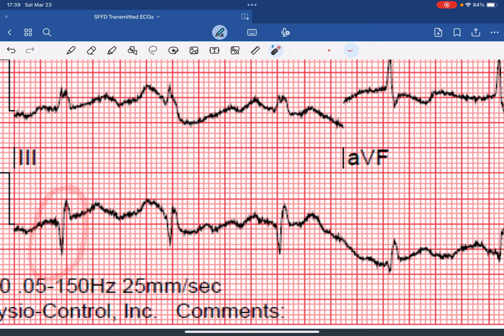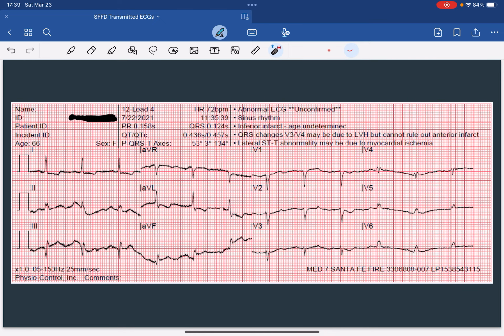more specifically one associated with acute inferior MI. Based off of the information at hand, based off of the history of present illness, maybe your patient looks kind of sick, looks kind of unwell, this unshakable feeling that she's not doing so hot, it would be fair to manage her for an acute coronary syndrome based off of these findings: the ST depression and inverted T waves seen here in AVL and lead 1, and then the straightening of the T waves, the hyperacute T waves, and the large daggerish-looking Q waves that have developed.